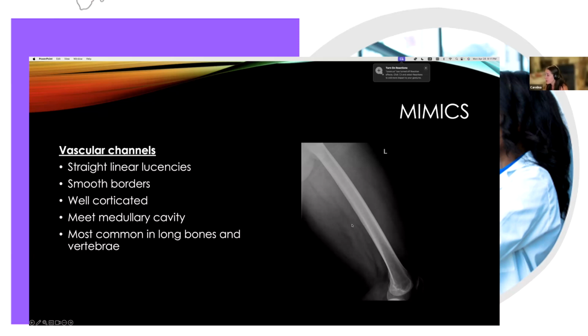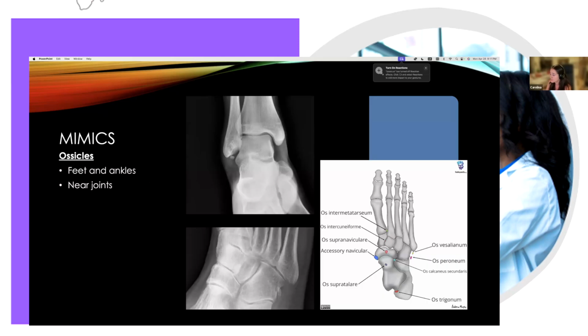It is very well corticated and it meets the medullary cavity. So this is just a vessel that is going through and not a fracture. And it's very common in long bones and vertebrae. So just take that into account.